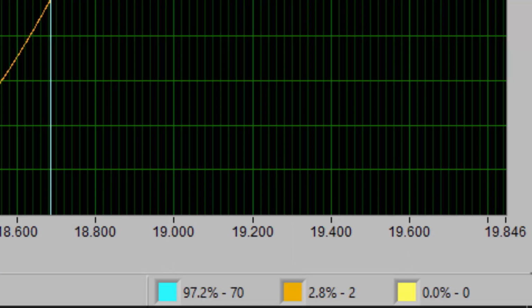As you estimate peaks and perform edits, pay attention to these numbers. Although there are no hard limits enforced by the application, it is generally recommended to limit the number of estimated peaks to no more than 10% of the total peaks in the segment.